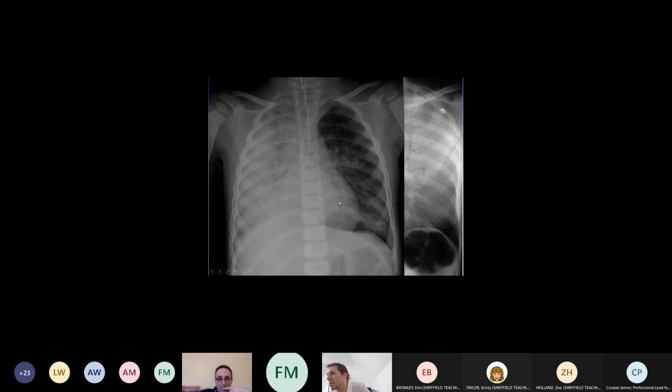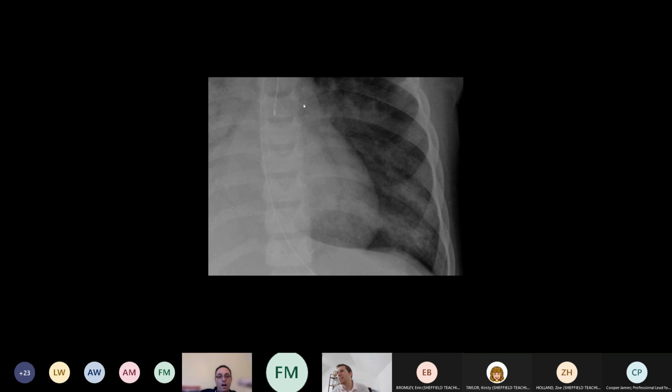This? Yeah. So that is another air bronchogram. That's an airway. You can see it branching there, coming down here, branching there, branching there. You might not be able to see as well as I can. I'm seeing this on a PAC screen, so it's good resolution. But it's one of the first things that we learn when we're learning how to interpret chest X-rays, is how our eyes play tricks on us.